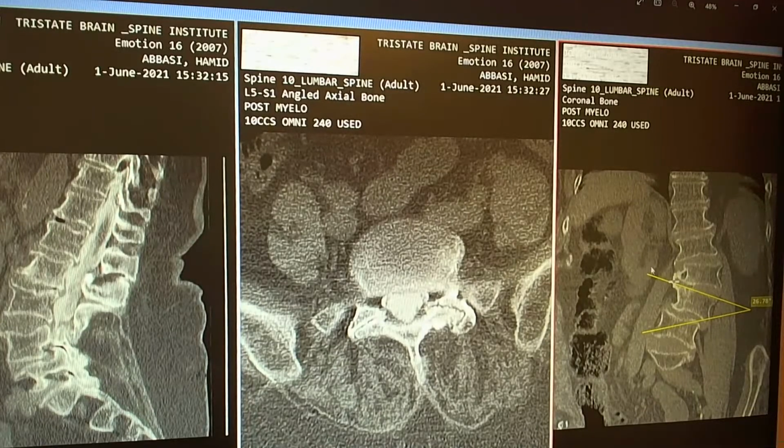First of all, who can tell me what angle I'm measuring here? The reason you don't see the angle exactly is that this program is not perfect, but this line here represents the plane here. So I'm measuring the angle between this bone and this bone.